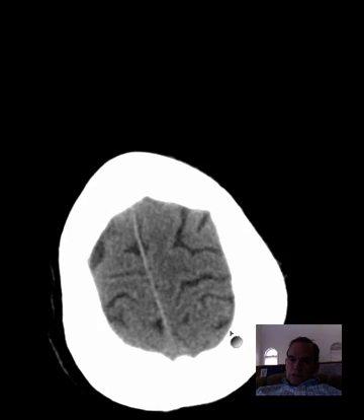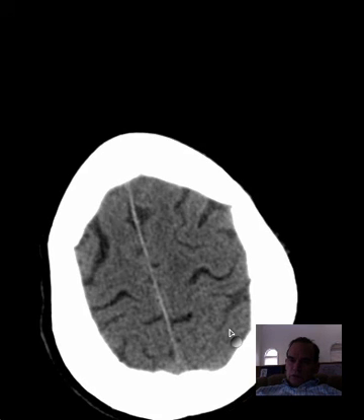So that's the easiest way to distinguish frontal and parietal lobes, is by going to the cingulate sulcus, seeing the central sulcus as forward and lateral to that, and knowing that this central sulcus is right between the motor cortex of the frontal lobe and the sensory cortex of the parietal lobe.